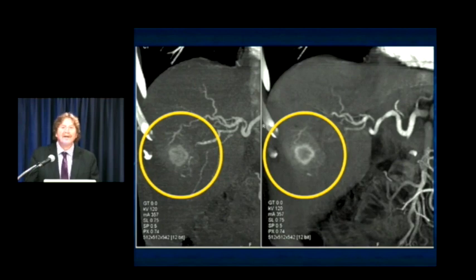The only question to me here is what's the primary? I guess theoretically it could be hepatoma. This was metastatic neuroendocrine tumor to the liver. Could be renal cell potentially, but the point is the appearance of the lesion tells you everything.